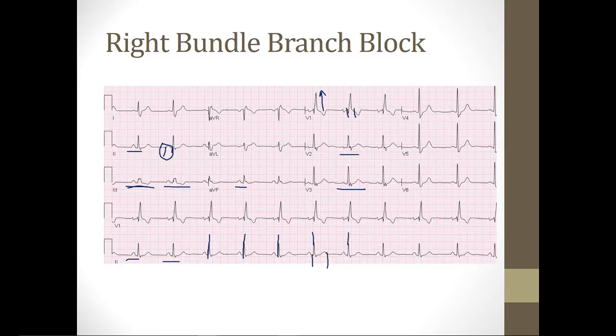You can see that it's less than half the distance between the QRS complexes, or half the RR interval, and therefore we have a normal QT interval. So we do not have prolongation of the PR interval or the QT interval. And then finally, we look at the T waves and the ST segments. Now, you can see that T waves are inverted here in lead V1.